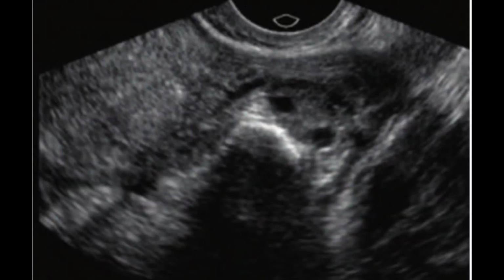The one thing that is required here is to look at the Doppler and the vascularity. If the fallopian tube is surrounded by vascularity, or if its wall is vascular, and if there is any other vascularity in the surrounding area, this would be picked up and labeled as pelvic inflammatory disease. However, this would be a mild degree of pelvic inflammatory disease. That's why this image is shown to you, that even a mild degree of fallopian tube dilatation can lead to pelvic inflammatory disease.